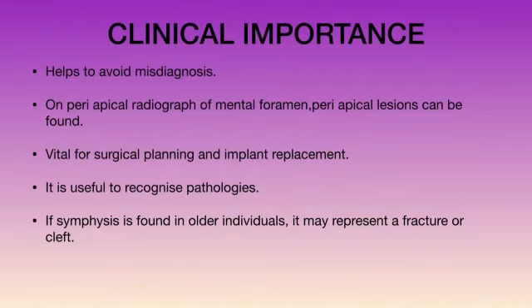When we step into the clinical importance, it helps to avoid misdiagnosis. On periapical radiograph of the mental foramen, periapical lesions can be found, which is vital for surgical planning and implant replacement. It is useful to recognize pathologies. If symphysis is found in older individuals, it may represent a fracture or cleft.